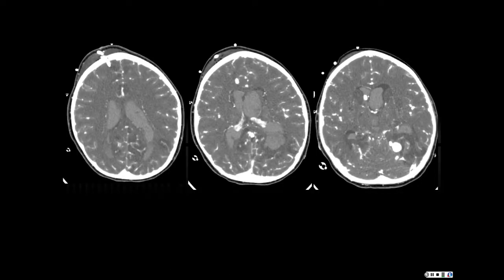Yikes. This was a young patient. This is one of my first pediatric angiograms in fellowship. Patient presented with blood-filled ventricles. This is all blood. This patient's got hydrocephalus, probably from the volume of the blood, as well as clogging up of the arachnoid granulations. This is really, really bad. Patient was shunted. We did an angiogram.